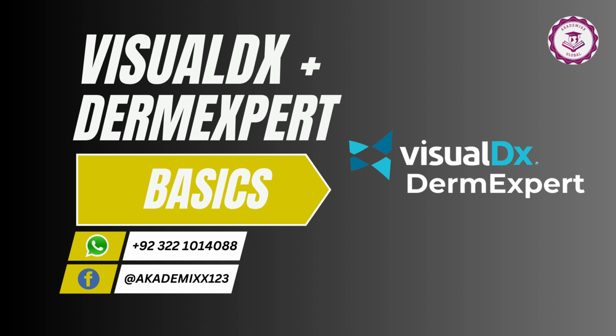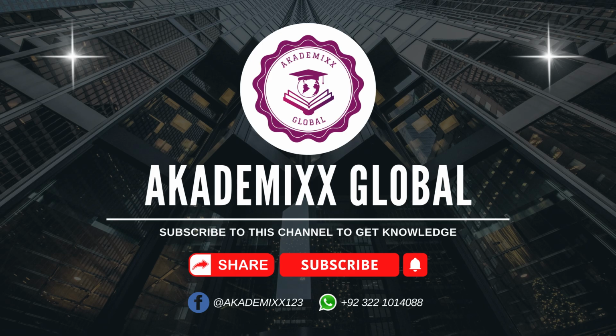VisualDx plus DermExpert speeds up clinical decision making. It reduces diagnostic errors. It is also great for teaching medical students and residents. And that's how you can use VisualDx plus DermExpert to sharpen your diagnostic skills and make better clinical decisions.